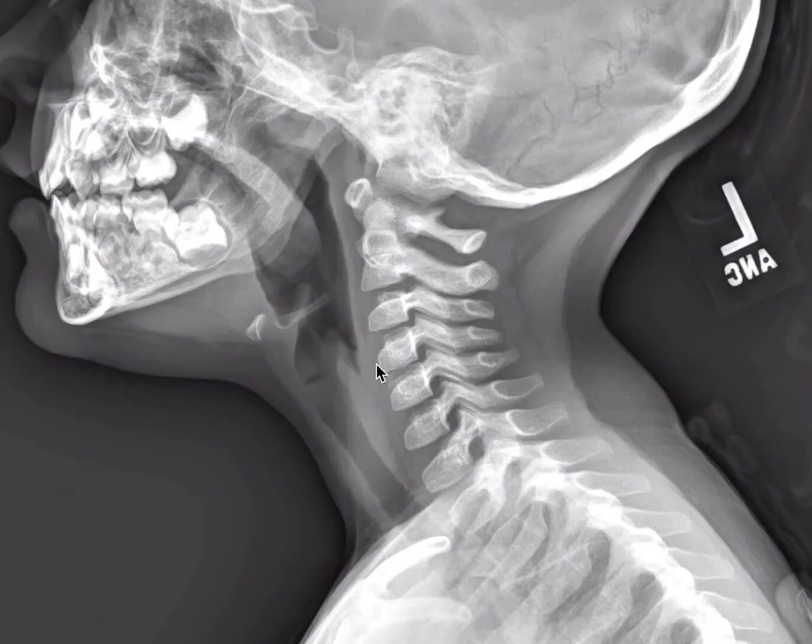Let's now go more anteriorly and talk about the airways and the laryngeal cartilages. The nasal cavity, seen up here, opens posteriorly into the nasopharynx. The oral cavity opens posteriorly into the oropharynx. The roof of the soft palate, seen along here, will separate the nasopharynx from the oropharynx. The soft palate itself, as well as the base of the tongue, are considered oropharyngeal structures.